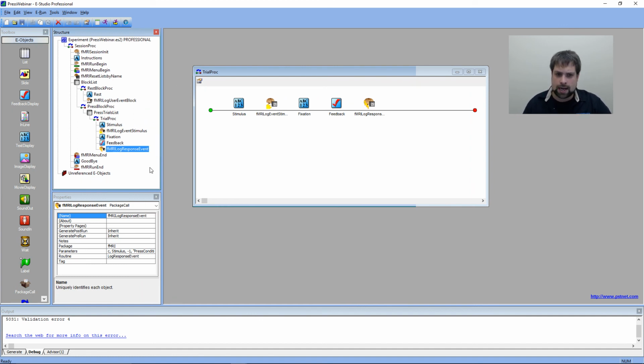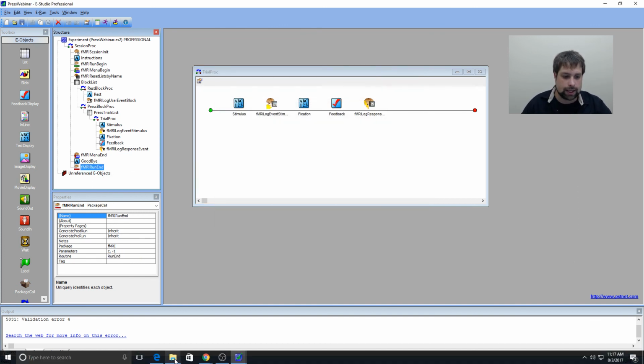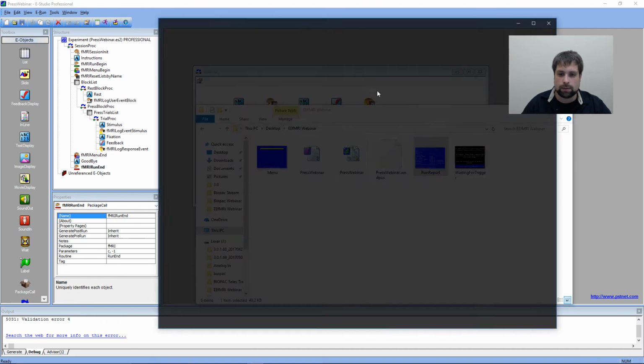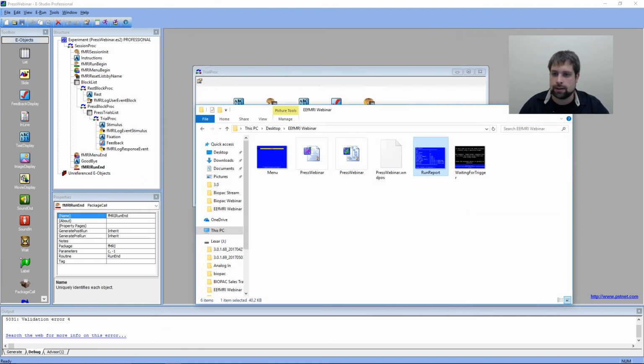So now all of the data that I'm going to be collecting not only is going to be written to my EDAT file, but it'll also be written to that supplemental PDAT file as well. That way I have a whole text file, or what we call a PDAT file, that has all of this really relevant information to my scan. And at the end, I'm even going to show researchers in particular this run report, and it's going to tell me more information about my run right away, just so I have a clear indication of where my data is going right when the run's finished.